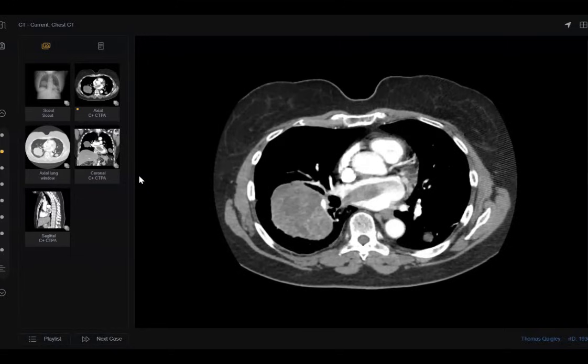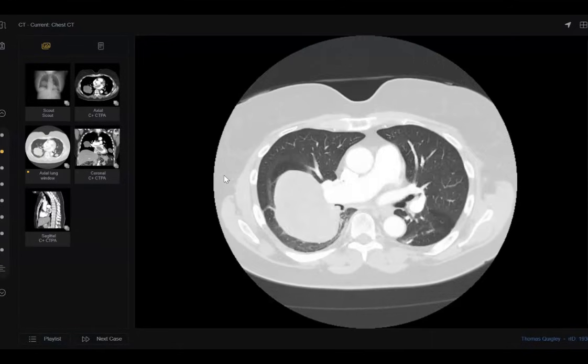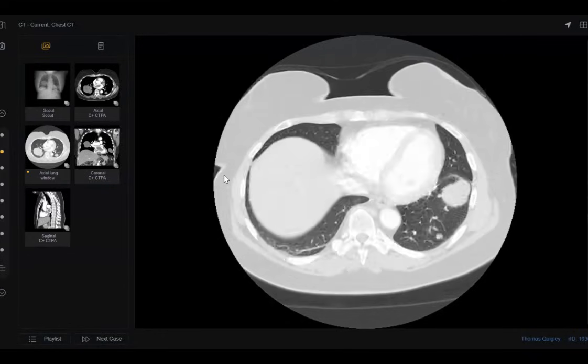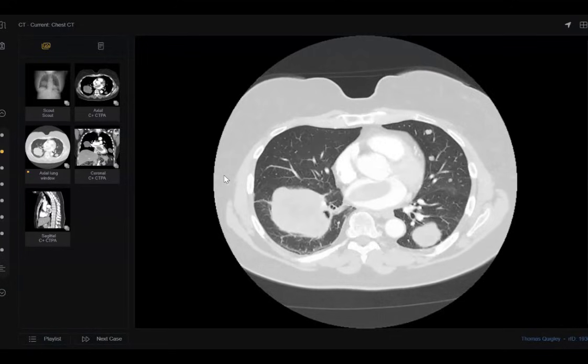So this is likely tumor thrombus extending from the mass into the left atrium. I would also like to see the lung window to see if there is any endobronchial extension of the mass. I can clearly appreciate that the mass is extending into the right bronchus. Based on these findings, my differentials include primary lung malignancy with satellite nodules in the opposite left lung. I would also like to see the breast on these CT images.